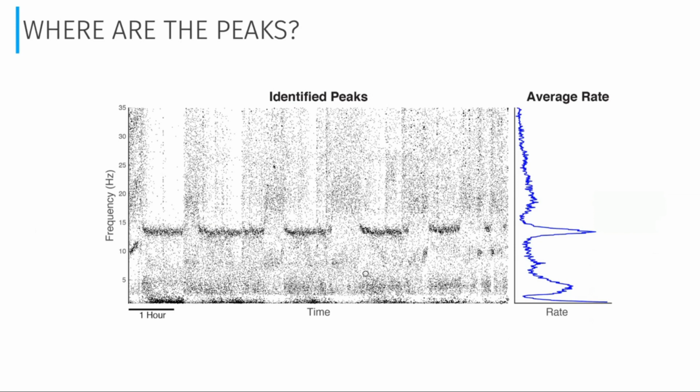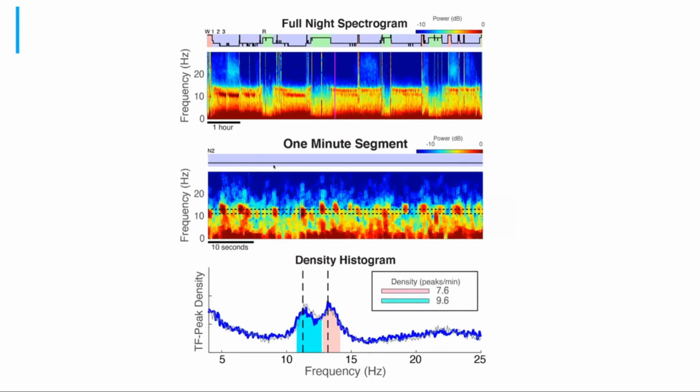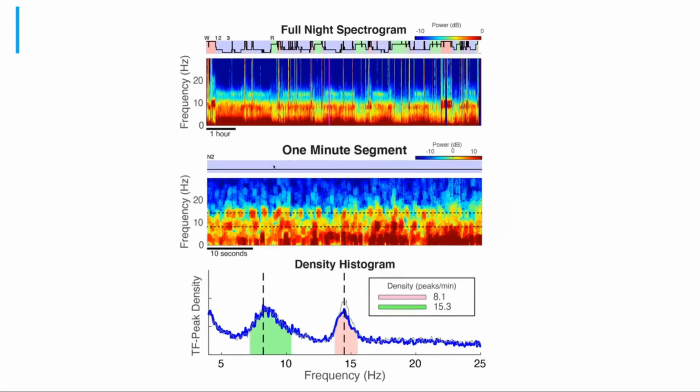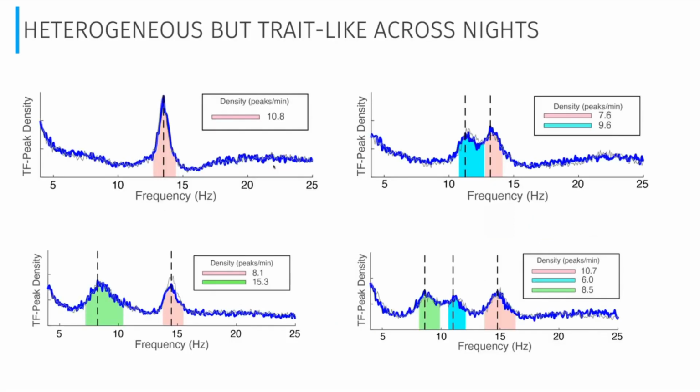And when we looked at this across subjects, it was really interesting. In a cohort of very well triaged, healthy subjects, we saw a lot of differences. We had some subjects with 1 bump, 2 bumps, maybe fast and slow spindles that we know about. Then we saw bumps in the low alpha range, along with some traditional spindle range activity. And then we saw some with 3 and even more. The variation was incredible for this small group of very well triaged, healthy, normal subjects. So what you can see is that these are heterogeneous.